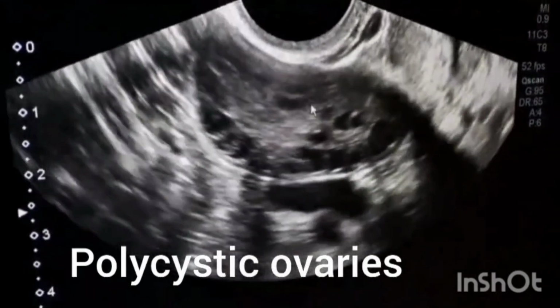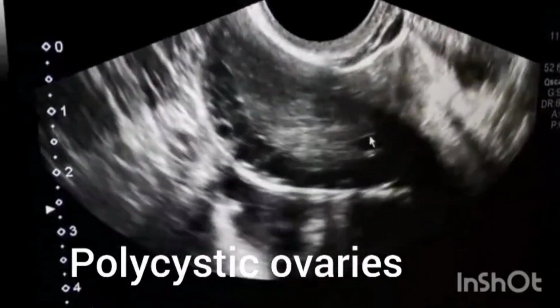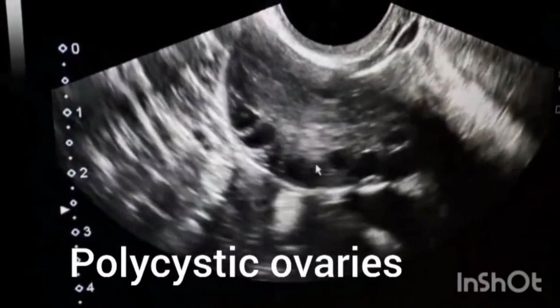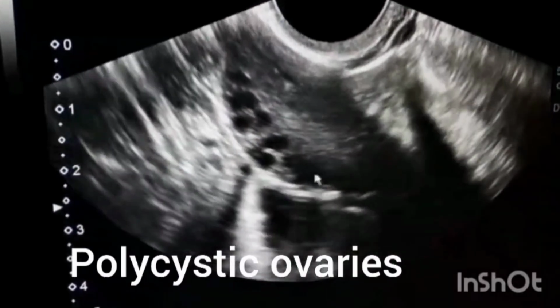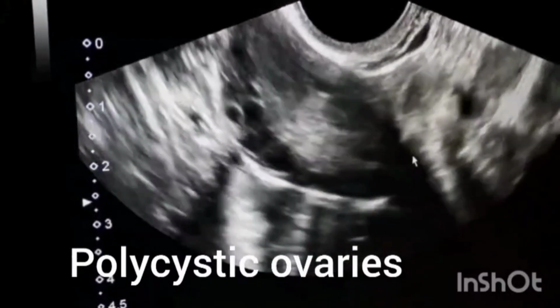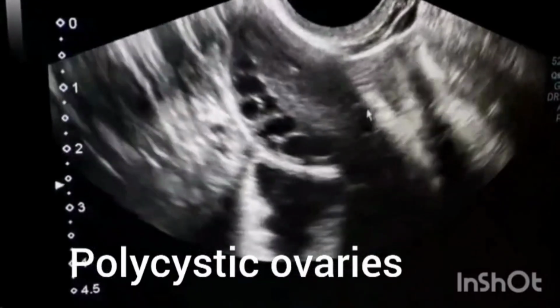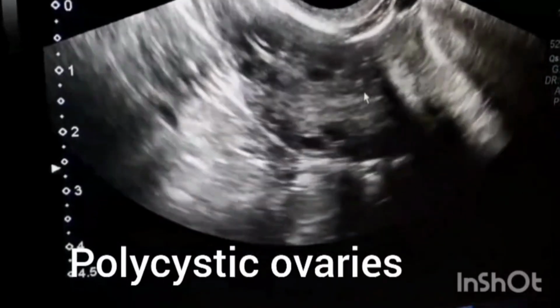These are small follicles arranged around the central thick echogenic stroma. All follicles are arranged at the periphery with thick echogenic stroma. So, increased ovarian volume and increased number of small follicles less than 10 millimeter.